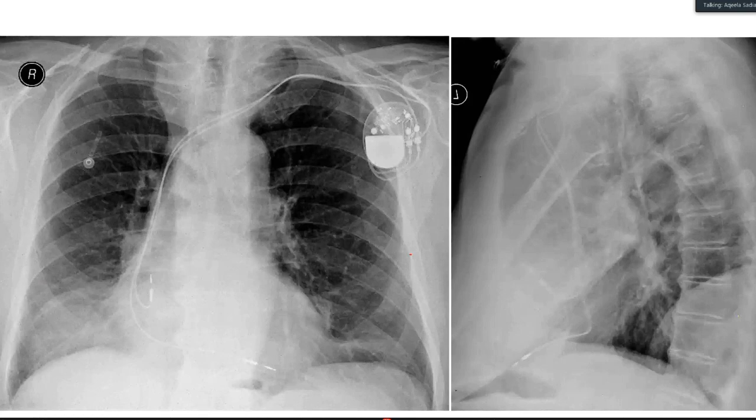I think if I see on the lateral view, I think right is all right. So you know the left diaphragm disappears when it reaches the border of the heart, and the right one can be seen continuously. All right.